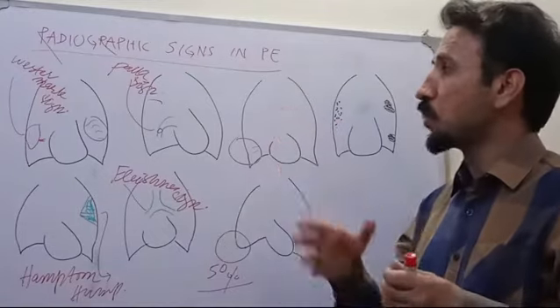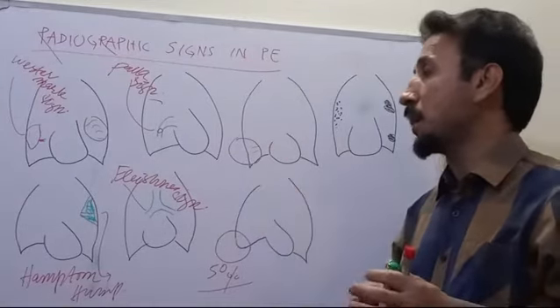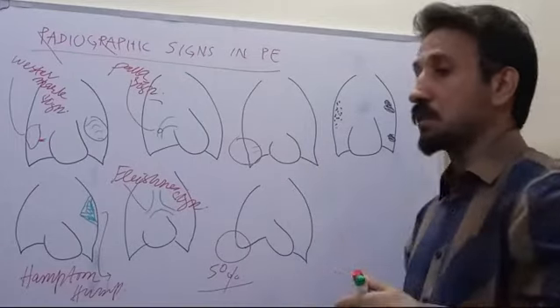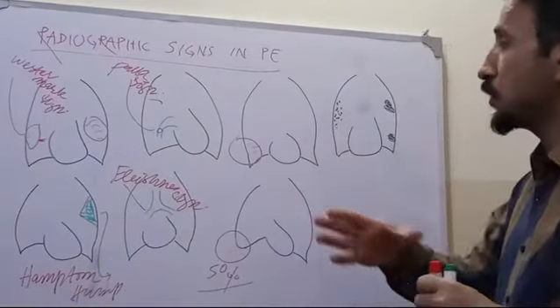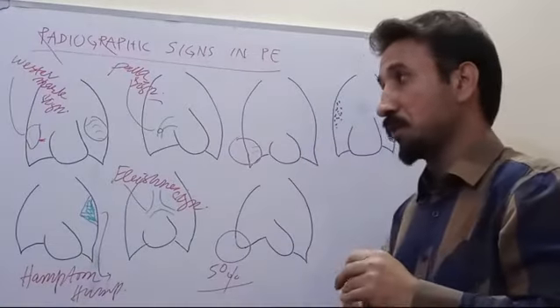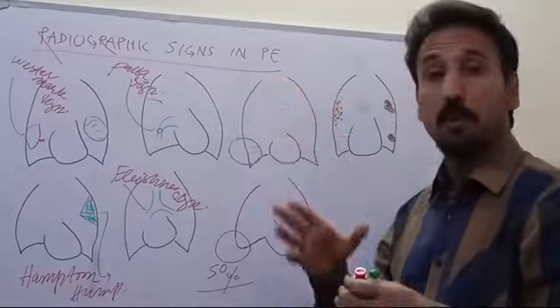So in dealing with pulmonary embolism, the chest X-ray may be very helpful in the diagnosis and consequently the management of pulmonary embolism if we just look and have an understanding of the chest X-ray abnormalities in pulmonary embolism.